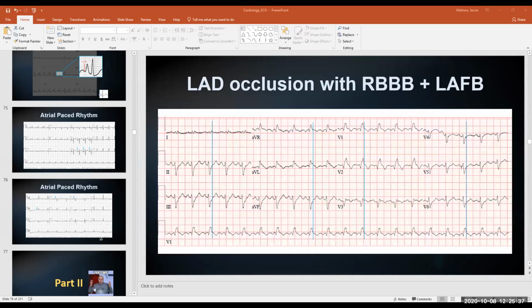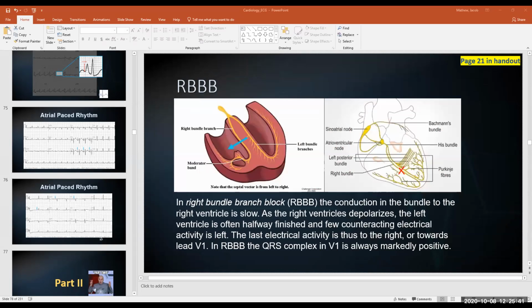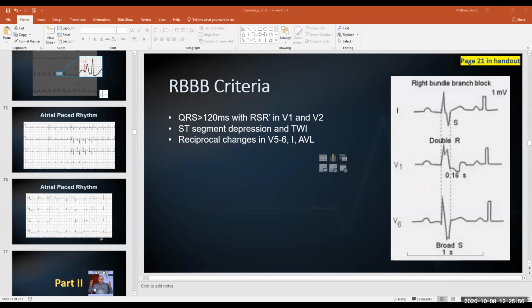go up positive. I tried to draw over that, but it was completely off. So hopefully that makes sense. You can see that the disease is on the right side, which is why it's called right bundle branch block. So the electrical activity can preferentially go down the left, but its ability to eventually go to the right side is going to be delayed because of that disease, resulting in that rabbit ear appearance.